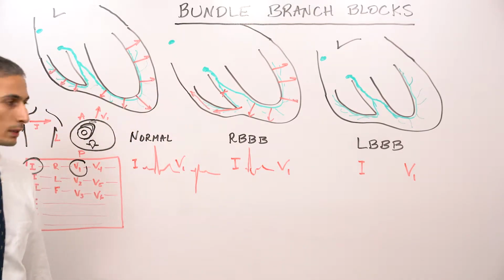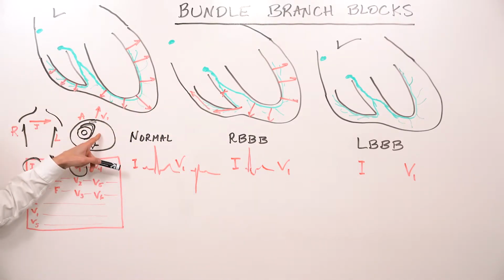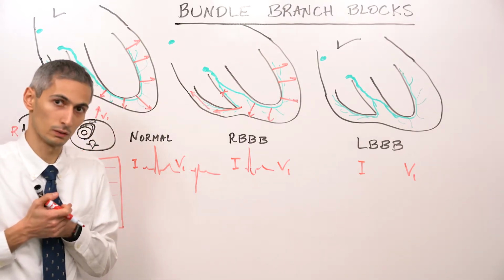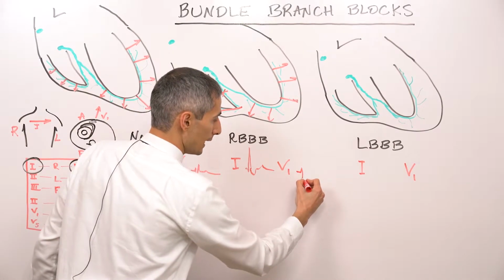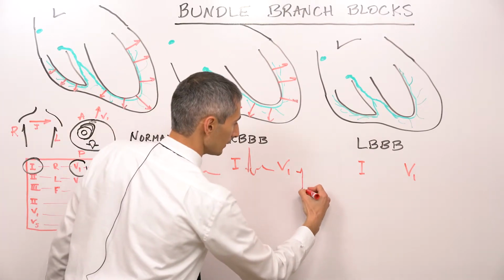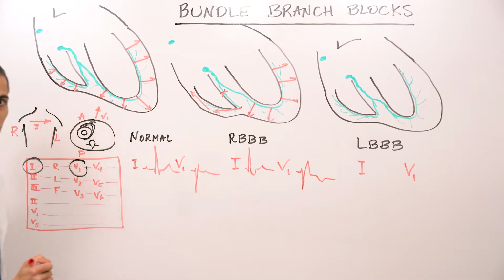depolarization. Whereas in lead V1, which is a lead that points out of the chest as drawn here, because the right ventricle is actually the anterior ventricle wrapped around the left ventricle, you get your normal negative posterior direction depolarization of the left ventricle into the chest. And then you get a late positive out of the chest depolarization that is the lengthwise depolarization of the right ventricle.